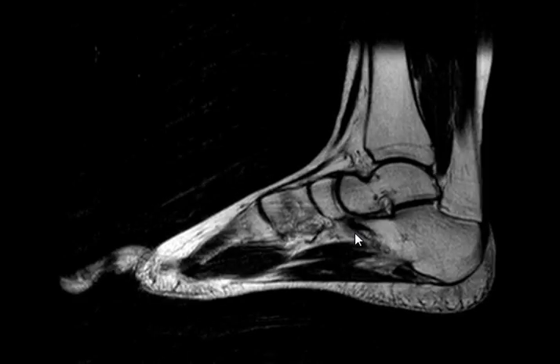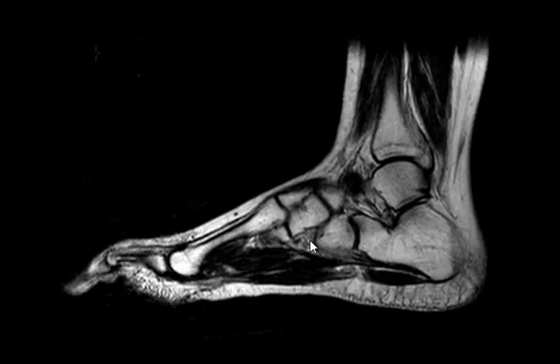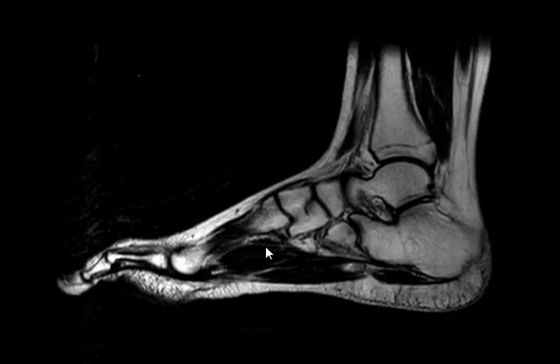It's showing to the toe the image. So this is a foot, ankle and foot. If the ankle joint will be mainly focused on the ankle itself, you will not see the tip of the toe.